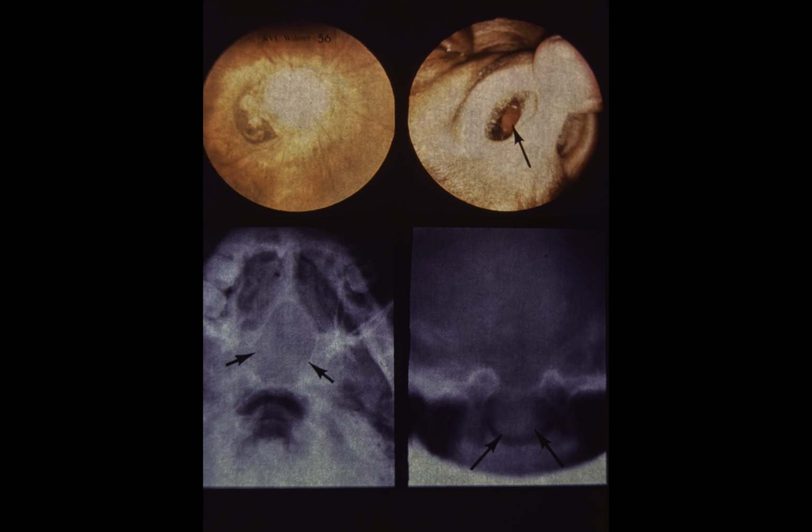Lower left. Basal skull X-ray demonstrates a large defect in the bony floor of the skull. Lower right. Basal polytomography demonstrates a soft tissue mass protruding through the defect in the base of the skull. The association of basal encephalocele and optic disc anomalies was first described in 1968. Patients with this syndrome typically have short stature, a flattened nasal bridge, hypertelorism, and a cleft palate or cleft lip.